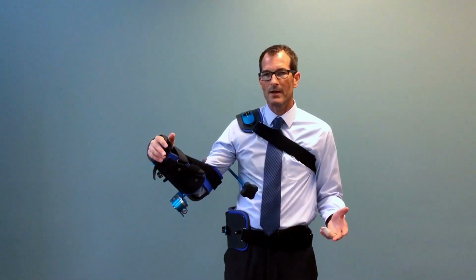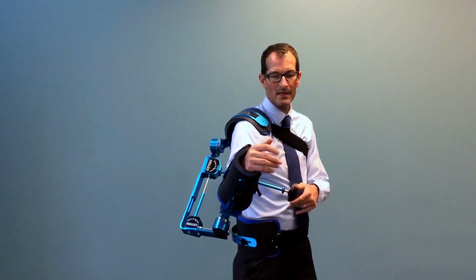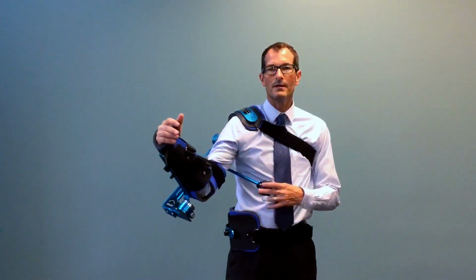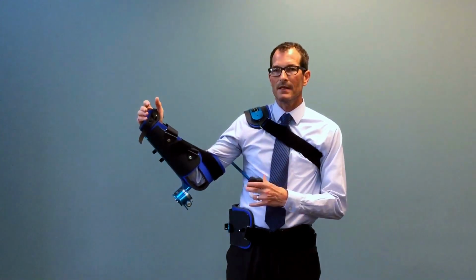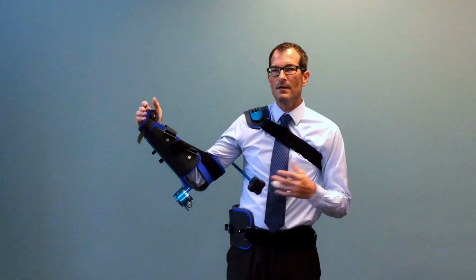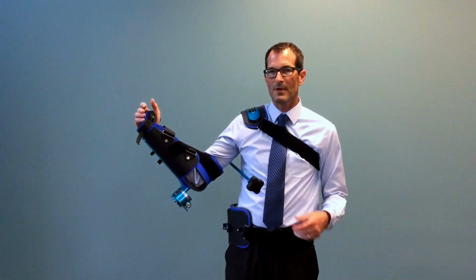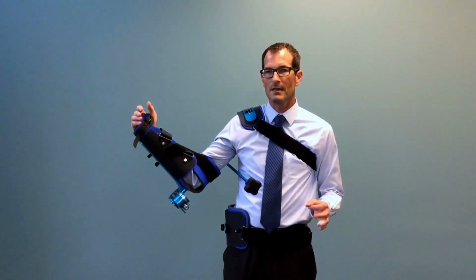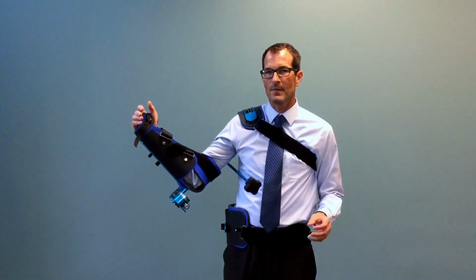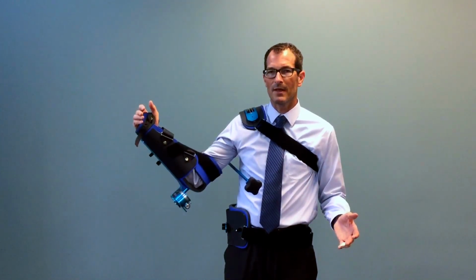An additional reason why it goes beyond anatomical norm is because we wanted to have a device that went well into external rotation. We did this in the design process intentionally, knowing that we would be calling on sports medicine, occupational therapists and physical therapists, as well as sports medicine physicians who are seeing a high-level athlete who's going to need more external rotation than your average Joe population.